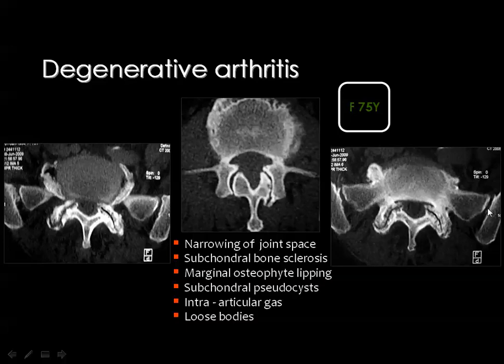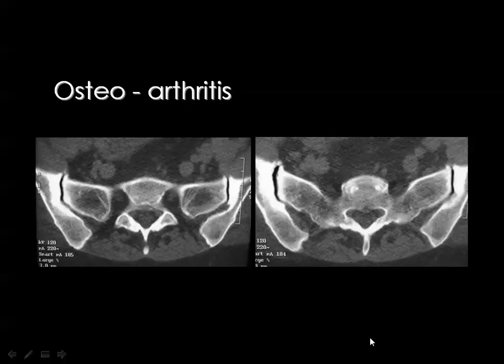And in the second patient, you can see bilateral, almost symmetrical osteoarthritis of the facet joints at the L5-S1 level. You know that osteoarthritis of the facet joints in the spine is usually bilateral and symmetric, unless there is a particular cause like scoliosis or poliomyelitis, for example, and this will lead to the development of osteoarthritis on one side compared to the opposite side.